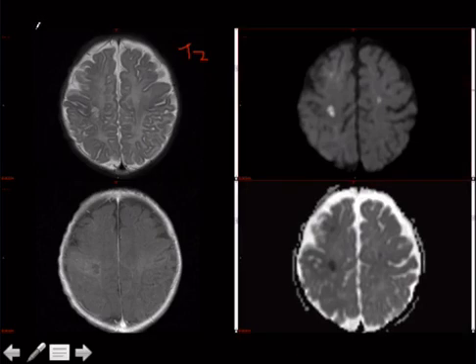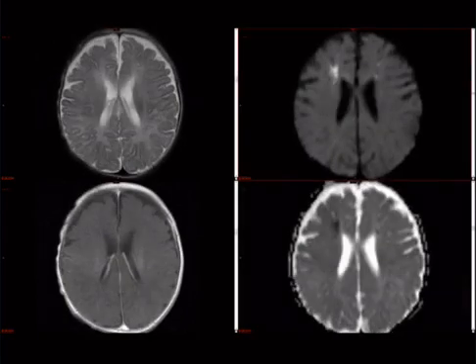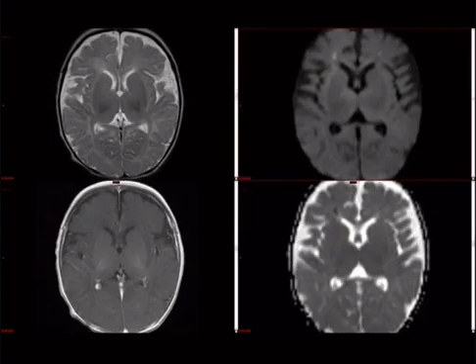So remember, in peds, on T1, you don't look like an adult until you're 1. And on T2, you don't look like you're an adult until you're 2. So this kid is less than 2. So it's flipped. It looks the other way because he hasn't myelinated his white matter yet. All right, so the purpose of this case is not to review that necessarily. It's to show you this here and here. So bilateral areas of restricted diffusion. As we scroll down, they're sort of deep. Okay, bilateral multiple layers. So this kid has had some kind of badness.